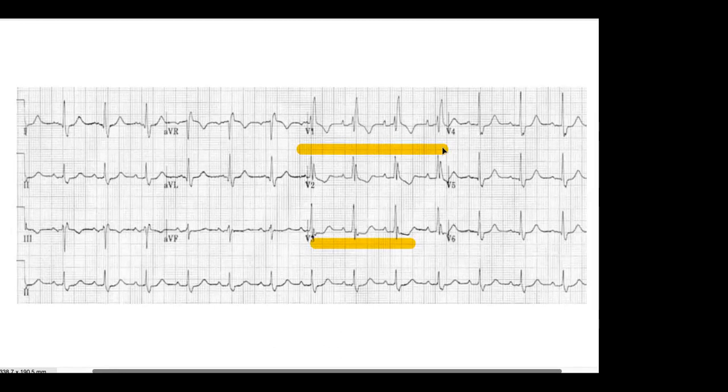And what did we say about the placement of the precordial electrodes? V1 tends to indicate pathologies located on the right side of the heart compared to V5. Okay. So probably it's a right heart issue. Okay, good. Now let's go to lead 1, 2, and lead 3.